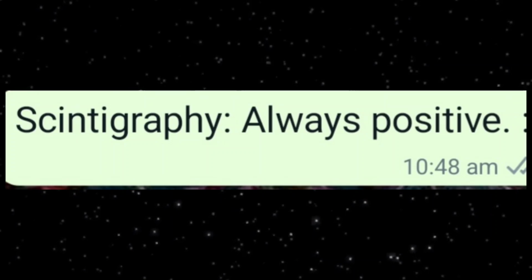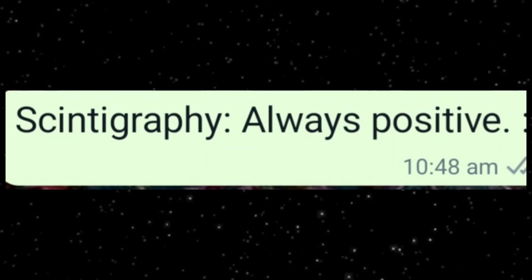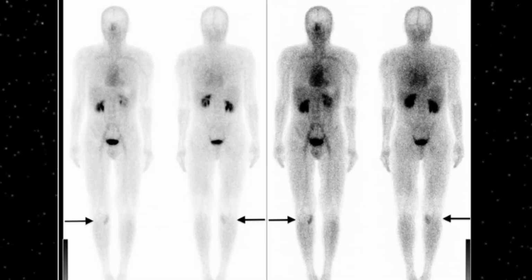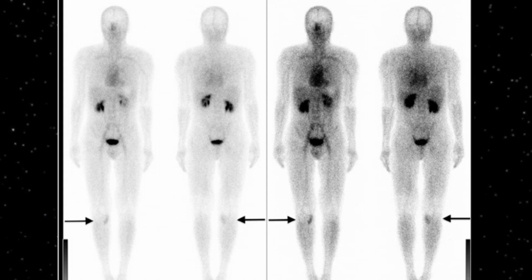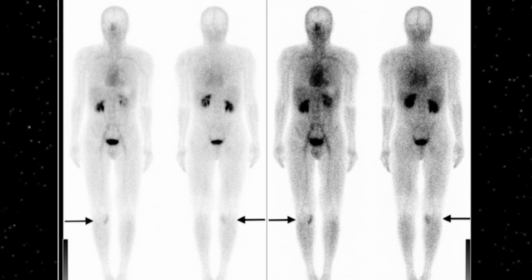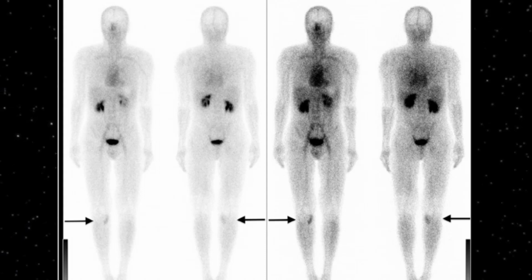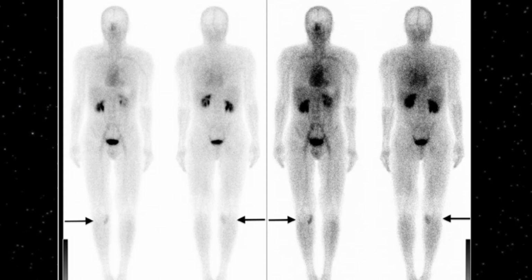Scintigraphy of osteoblastoma will always be positive. It will always take up tracer, and you can easily appreciate this on the bone scan. Here is an example of an osteoblastoma sitting in the tibial region, indicated by the black arrow. It shows increased uptake. So scintigraphy will always be positive, and this is another tool to confirm the presence of osteoblastoma.